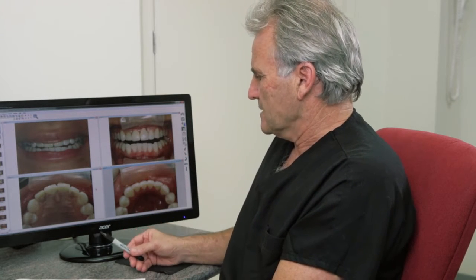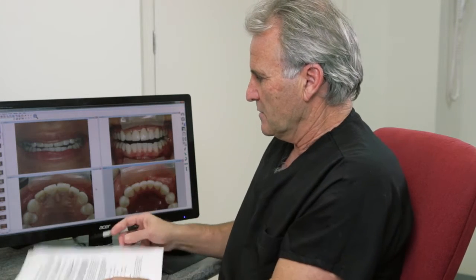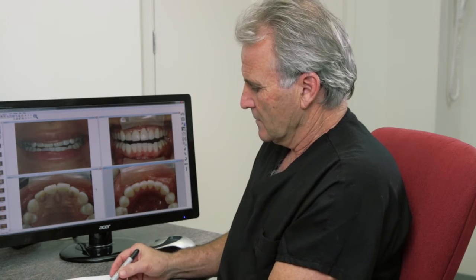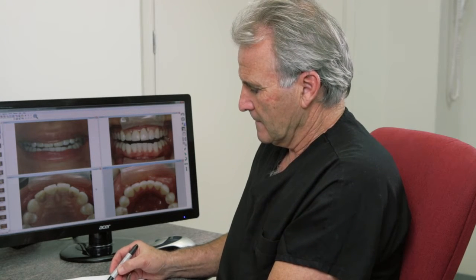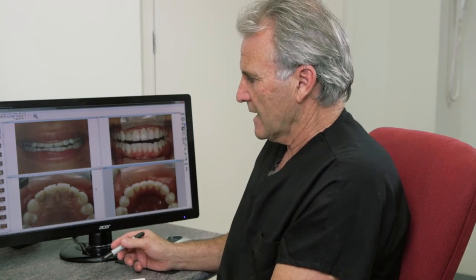Now, the patient may suggest if only one is to be done, they may say only one of them. My recommendation would be to do two. So in my templating area, under upper teeth, I would be putting two implant crowns, two adjacent crowns, and two veneers.